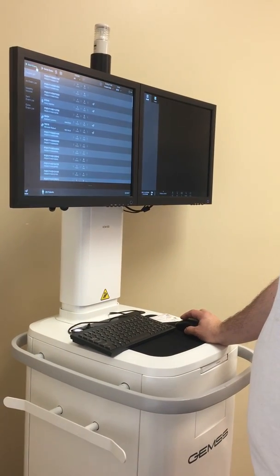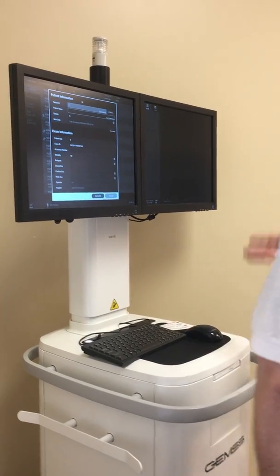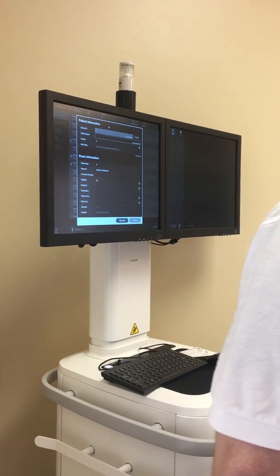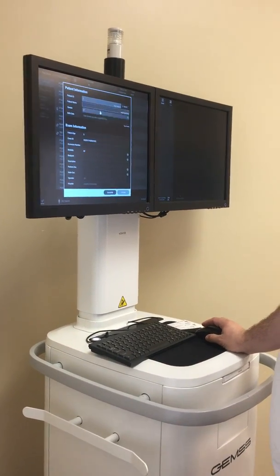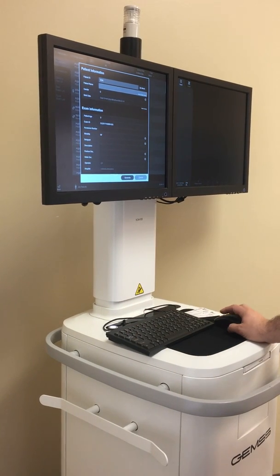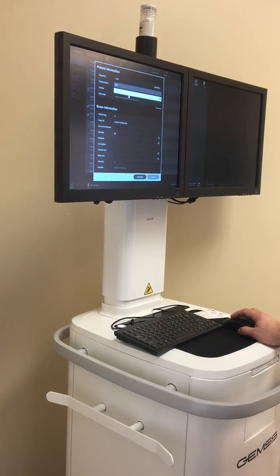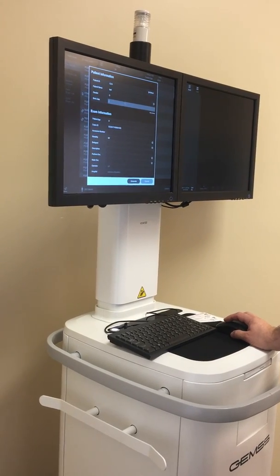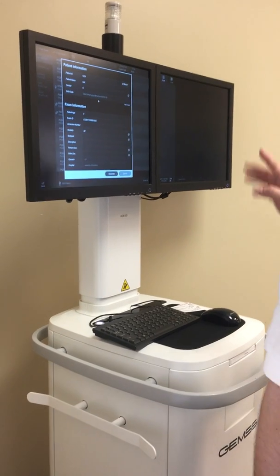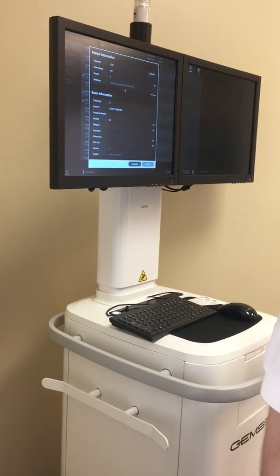We'll see, but let me just show you. Let's say he decides to start entering all the patient info and everything, and you're like, oh, he didn't show us how to do that. So you hit start exam, you put in a patient ID, a patient name, gender. This is where, when you register a patient, it gets confusing.